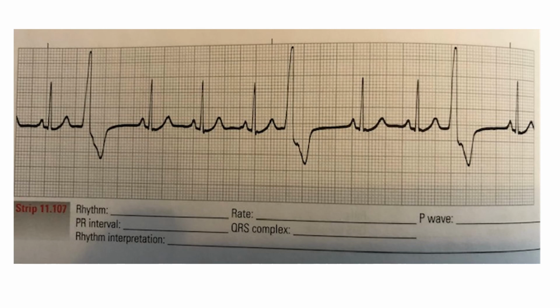In slide 21, this rhythm is irregular with PVCs, otherwise it's regular. So we have a heart rate of 88. You do have P waves before the normal QRSs. Your PR interval is 0.12 to 0.14. So the QRSs, your normal sinus beats, are 0.04 to 0.06. We know that they came from the SA node. Your QRSs are much wider.